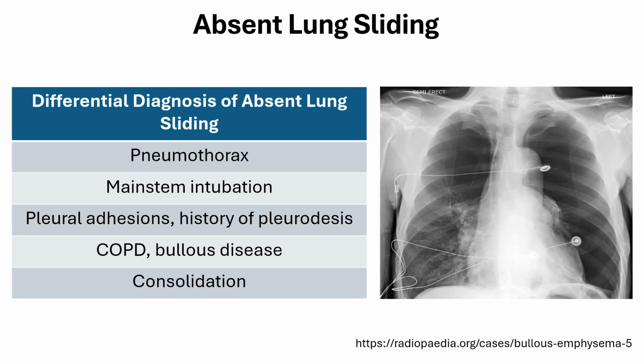And on this chest X-ray, you see severe emphysematous disease with large bilateral bullae, which are air-filled spaces due to destruction of normal lung parenchyma, and they do not represent pneumothorax, and they should not require a chest tube, which is actually a wrong thing to do for those patients.